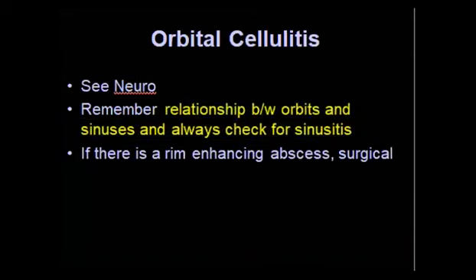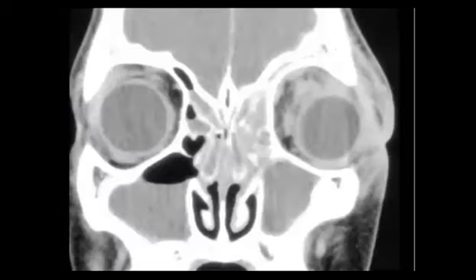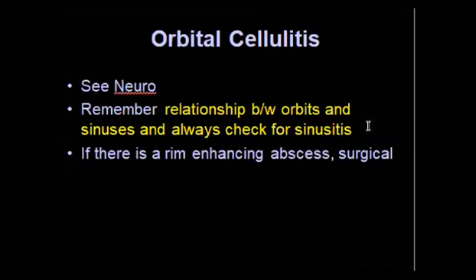Then I will ask you, Ala, again the same question. Take care about the age. So maybe you mean pseudotumor by infection, right? Not the other type of pseudotumor, like IgG4 and so on, right? So I agree with you that when you find sinusitis, it can include orbital pathology. It can cause orbital pathology. And this is the big relationship.